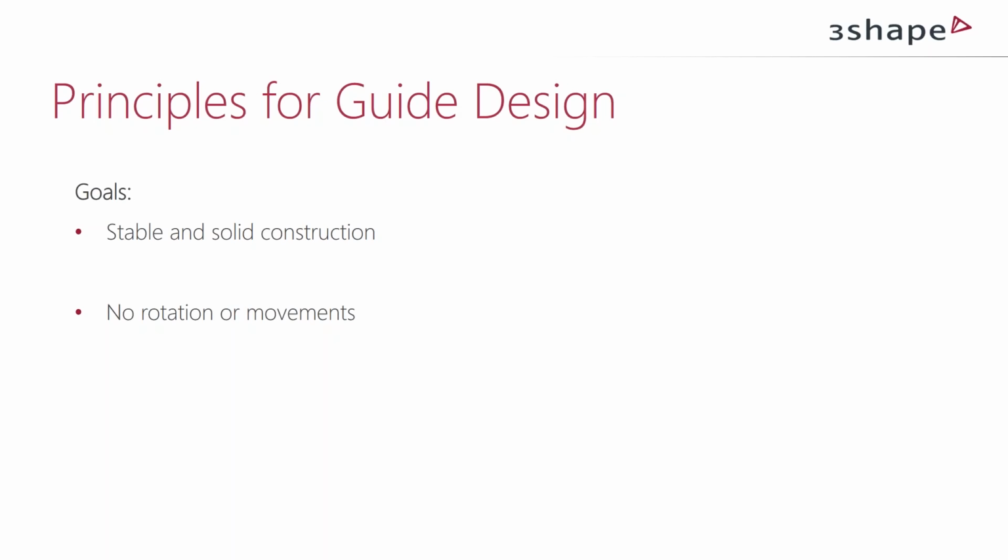We cannot allow any rotations or movements. When we place the guide on the teeth, the guide is not allowed to wiggle or to move back and forth. And it's not even allowed to come off so easy. So the retention is quite important.